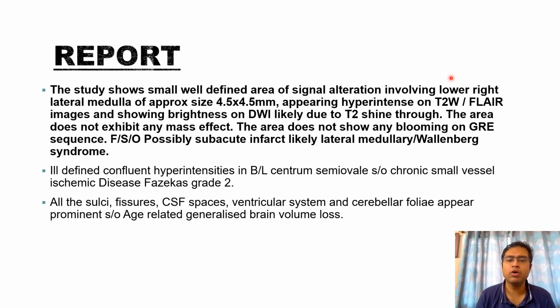There were some ill-defined confluent hyperintensities in bilateral centrum semiovale corresponding to chronic small vessel disease, Fazekas grade 2, and there were some age-related involutional changes as well.